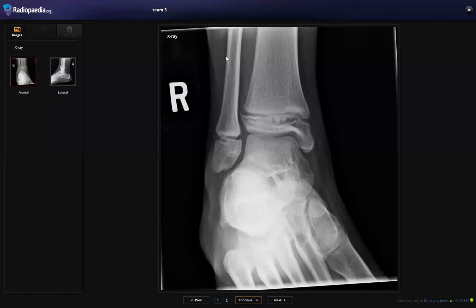This child injured his ankle during a basketball activity. Okay. I'm provided with the X-ray right ankle in a child having basketball injury. So I'm looking for any evidence of a trauma, and I could appreciate there is an irregularity of the growth plate in the distal end of the tibia, which shows sclerotic margins and irregular outline. And there is subtle overlying soft tissue swelling along the medial aspect and no obvious trauma. So I would like to assess the other views. The lateral views would be more helpful.